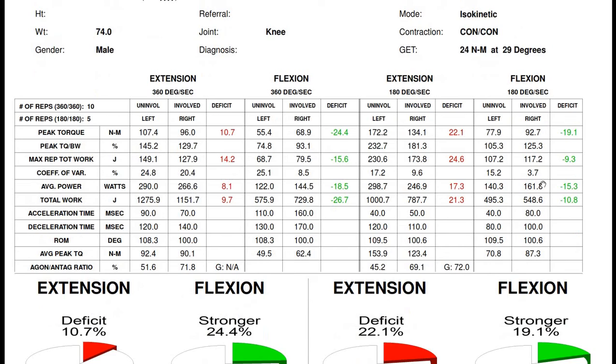However, if you have someone in a sporting environment, we would use a higher angular velocity, because we would be interested in the faster movements, essentially. So there are a lot of things to consider about the participant or the athlete before you begin, but we'll assume nothing. We will just look at the results as they are and see what we can make of them.